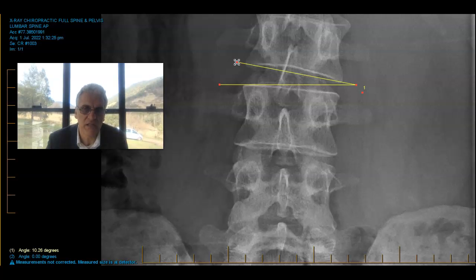And I'll give you the context here. This gentleman started with an 11-degree tilt in this area in here. It then dropped down to 7 degrees, and then 7 degrees again, and then 7.3 degrees again, before his fourth X-ray, which showed that his curve got worse. And it got worse, and it's now at 10.26. And I need to know why it got worse.